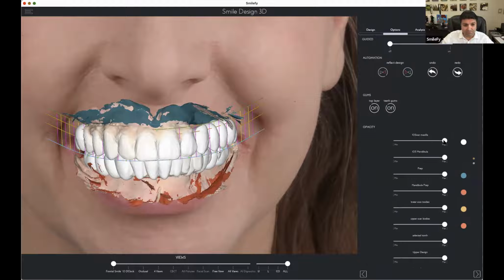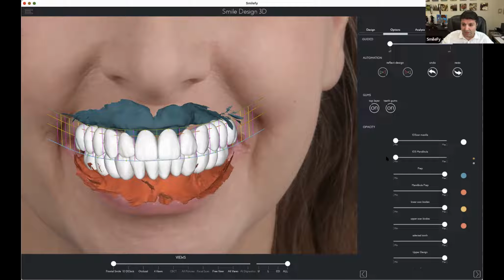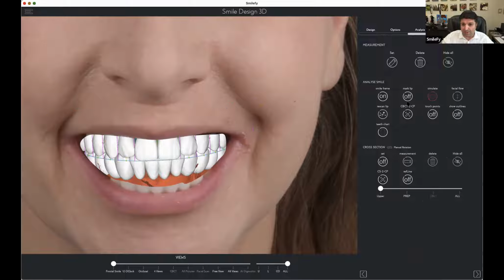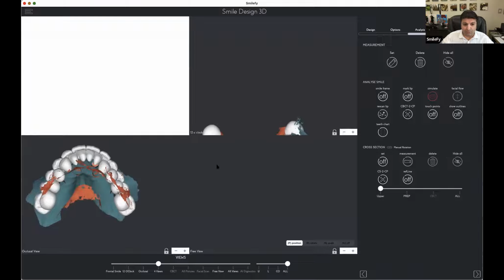So I'm gonna now reduce the opacity of the original bridge, reduce. I go to analysis. I'm gonna put the smile in the mouth, and I'm gonna go to 4 views.